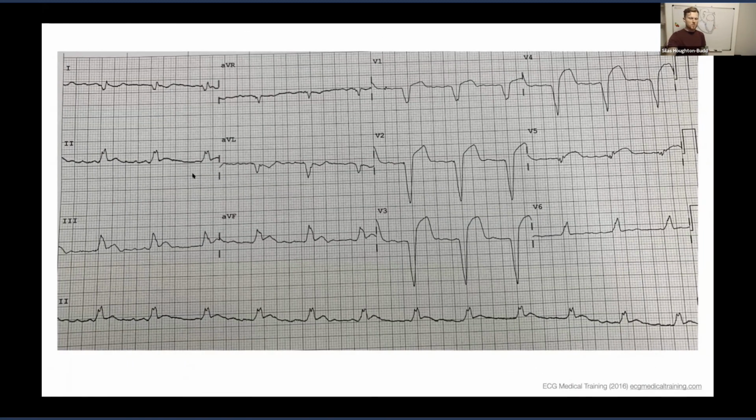So what the guidelines don't mention is something called the Smith-modified Sgarbossa criteria. They do mention the original Sgarbossa criteria. These are certain criteria that you can apply to an ECG with a left bundle branch block to assess whether the ST elevation is part of that block or is concerning for that patient. And this is an example.